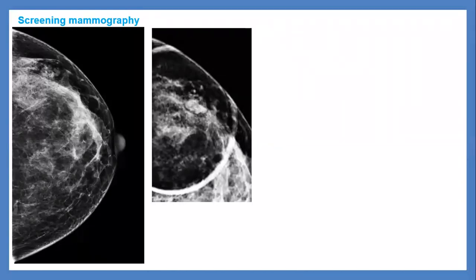Showing the mass is large, oval shape also. Why are you saying large? Is it very large mass? It could be more than 1 centimeter. Yeah, maybe 1 or 1.5. This magnification view, yes, 1 or 1.5 centimeter, maximum 2 centimeter length. And less than 1 centimeter width. Okay.